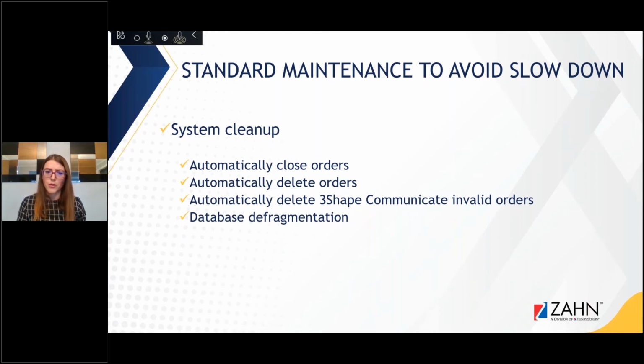So deleting the case out of 3Shape doesn't mean that you can't do anything with it anymore. If you're storing it somewhere else, you can always import it, and it will be same as if it never left your 3Shape. All the information will be there, the design will be there, the customer information, if you entered it, will be there. Nothing changes.